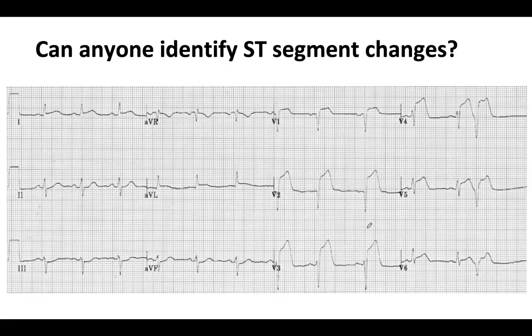And then we also can see some Q waves in V1 and V2. Really? Well, it's tiny in here.